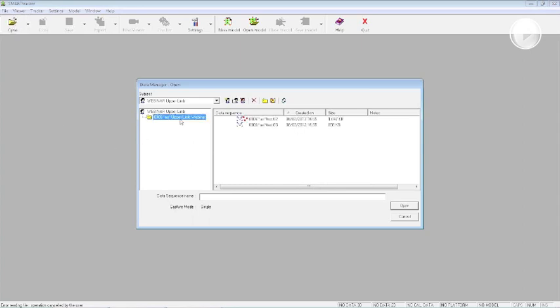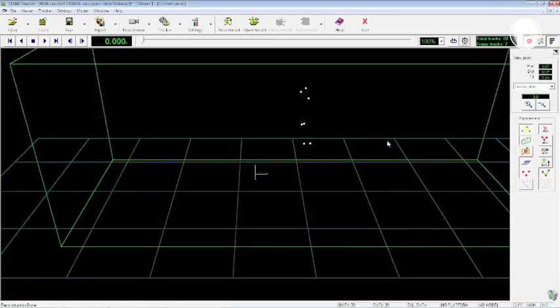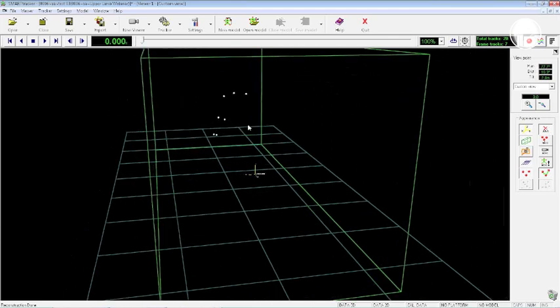Here there is the upper limb evaluation. Here is the trial that we are going to analyze. This is the first one that is already tracked because you can see that there are already the red dots. We're going to use the second trial. Here there are the markers acquired inside the volume calibrated in the lab.